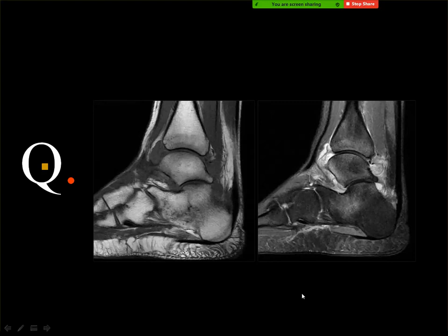Rheumatoid. Yes, this is a rheumatoid ankle. Synovitis is one of the signs of joint infection, and hypertrophic synovitis is one of the criteria of rheumatoid disease, especially in this particular area. But if you do not notice these signs, you can say just this is synovitis, and it is considered the right answer.